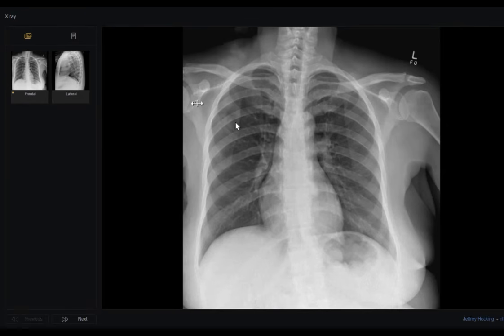I can see that the gastric air bubble shows some thickening and thumbprinting, I think. No retrocardiac shadow or mediastinal shift.